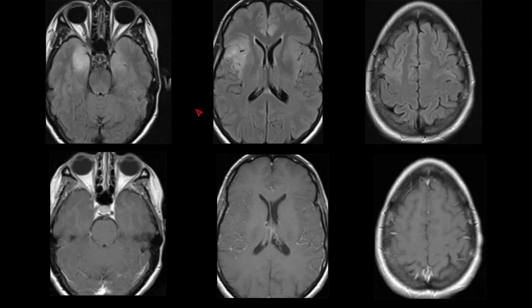So here's one really sneaky case of gliomatosis cerebri growth pattern. As you can see in the top left image, the case had white matter hyperintensity, cortical and juxtacortical, involving the medial temporal lobe, involving the insula, some of the operculum, as well as some of the frontal lobe here on the right side, a little bit of the cingulate gyrus maybe on the left. Not much enhancement of any of these areas of signal change.